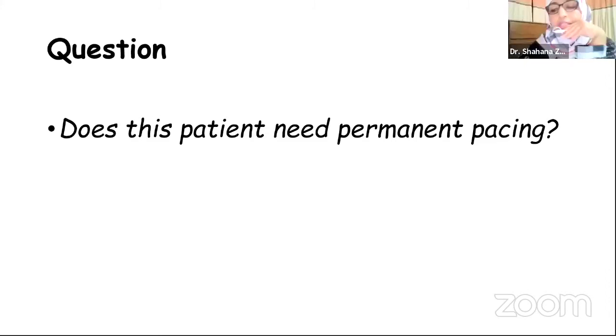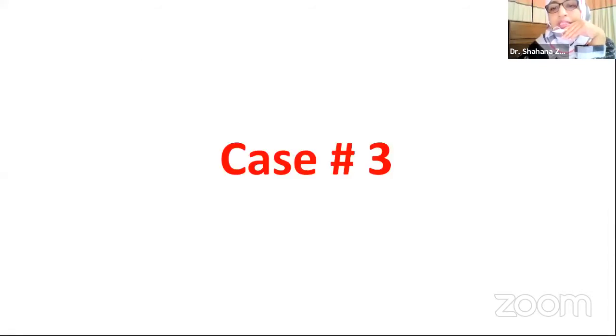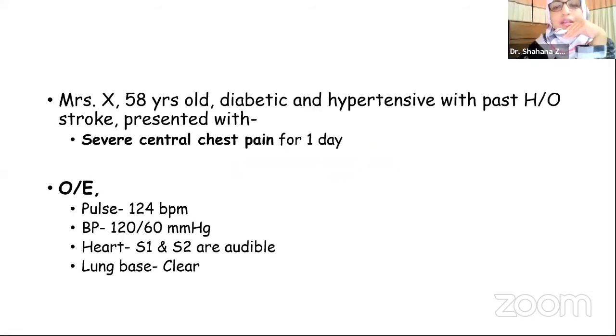Thank you, sir. Thank you for the expert opinion. I want to go to the next ECG. May I? Is it number 3? Yes, sir. So any comment about the previous ECG, Rafiq sir? Sir is perhaps not there.